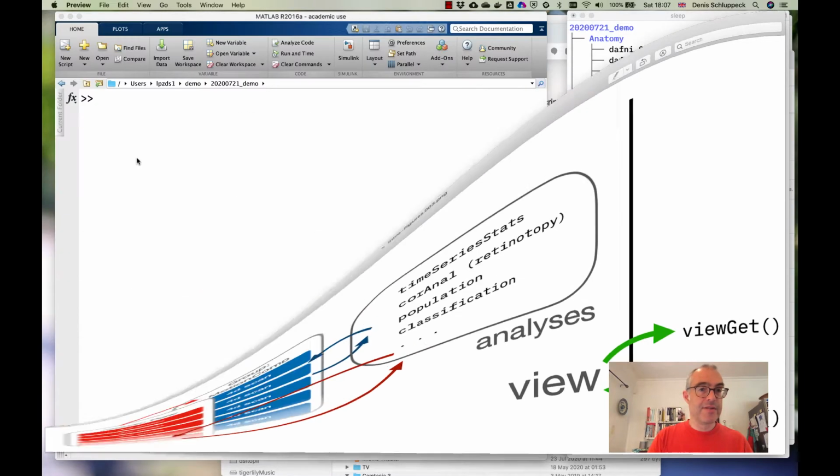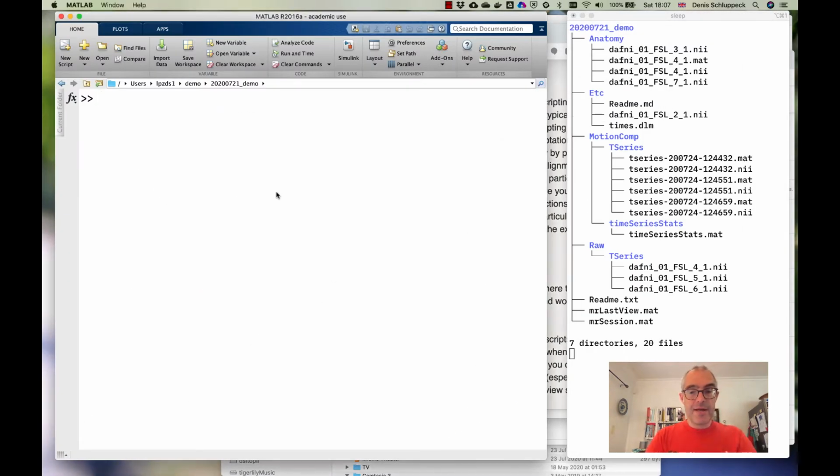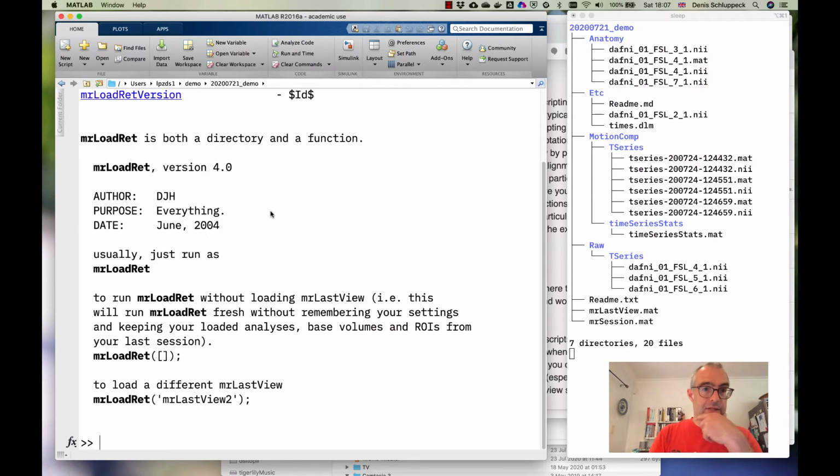So let me close this down. I am going to actually get help on mrLoadRet, so you can see what's there.